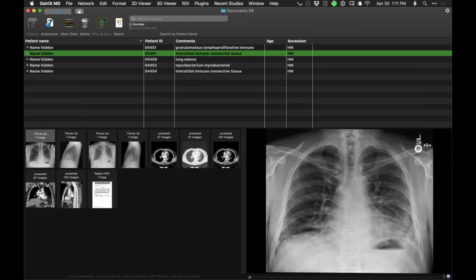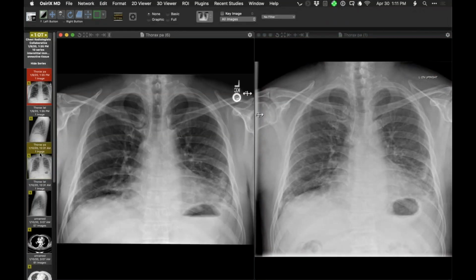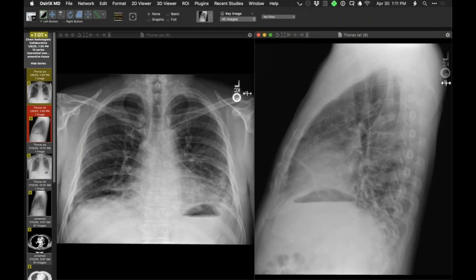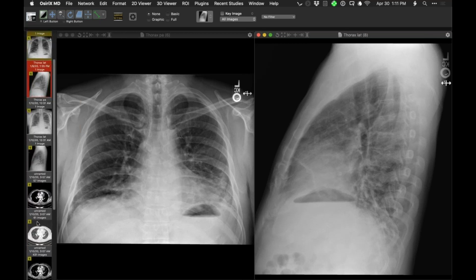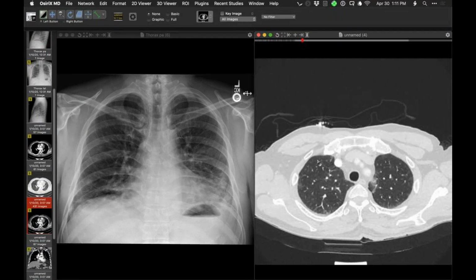Okay, this is a patient that came in with chest radiographs that looked like this. They're just 1 day apart, so they're going to share the same thing. But we have bibasilar lung disease. These I will simply describe as poorly marginated, confluent, subsegmental sized opacities on chest radiography, left slightly greater than right. And this CT will show you, I'll bring in the thin cuts, what the lung disease looks like.